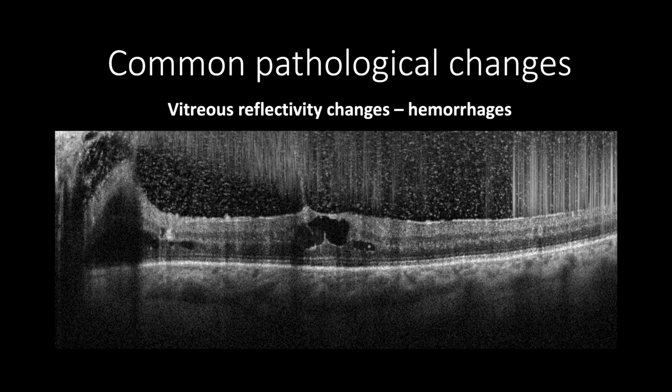Increased reflectivity of the vitreous in the form of hyperreflective dots may be found in vitreous hemorrhage and vitritis, as in this case of proliferative diabetic retinopathy with vitreous hemorrhage, as the heme appears as hyperreflective dots. However, the hyperreflective lines are artifacts from intravitreal hemorrhage located more anteriorly.